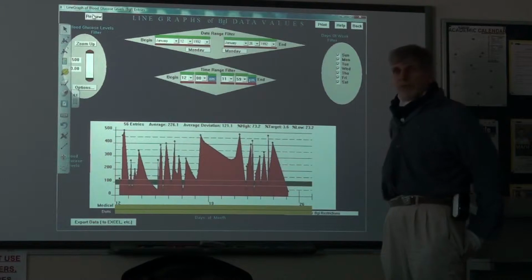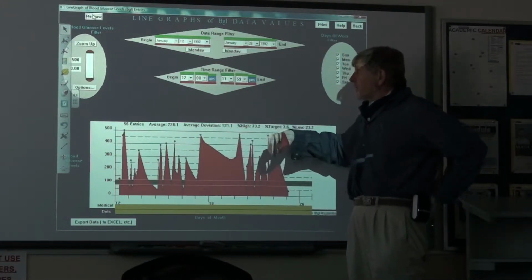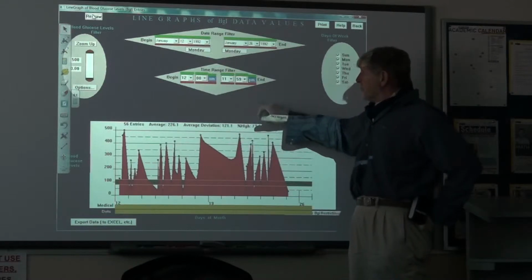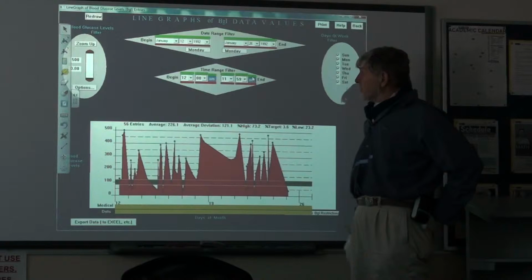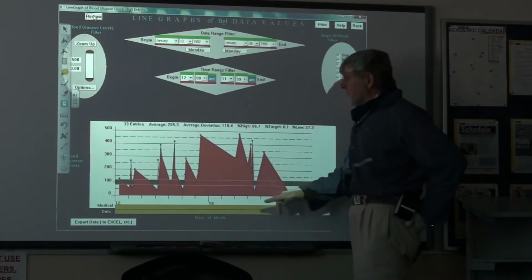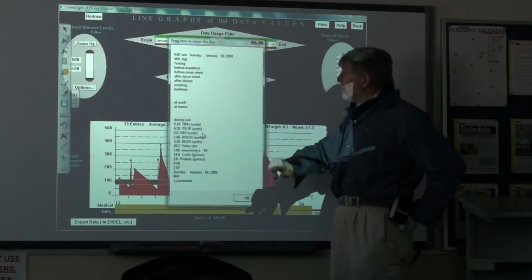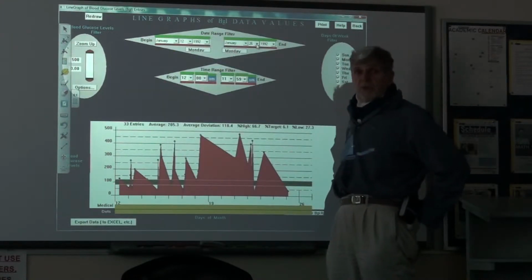For example, if you only want to look at your morning readings, then you will set the time range filter from 12 a.m. midnight to 11:59 a.m., which will just give you your morning readings. And then redraw, then all the readings that are present. If you click on any one of them, you will see that they have a morning time, because now you've filtered out the morning times.